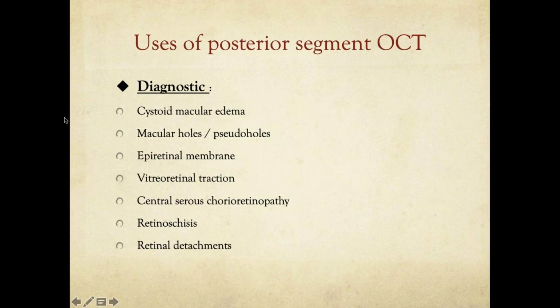The macular volume should also be taken into consideration, because even if the central macular thickness is normal, if the macular volume is disturbed and thicker, these eyes are likely to produce a more severe form of post-operative cystoid edema, and hence not a very good gain in vision or gain in letters post-surgically.